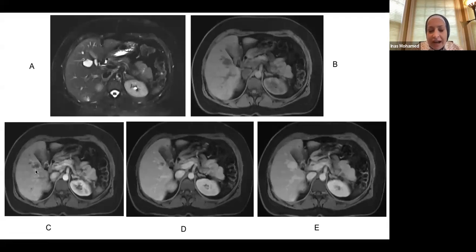For MRI of the liver in particular, we like the late arterial phase. So you have early arterial, late arterial. The late arterial is where the liver enhances better. It's around 25 to 30 seconds post-contrast injection. This sequence here is the portovenous phase. It's around 70 to 80 seconds post-contrast injection, and this is the delayed.